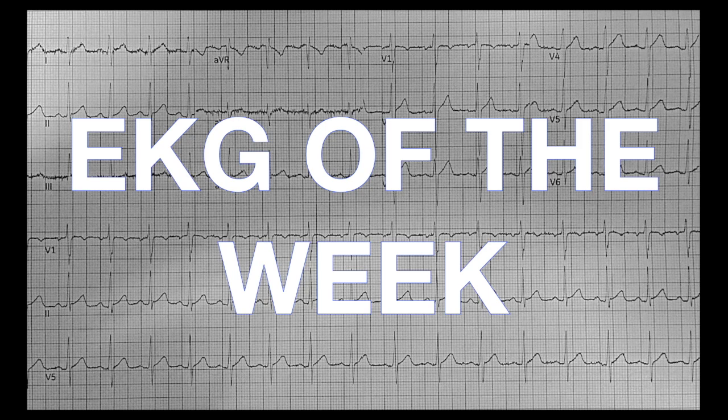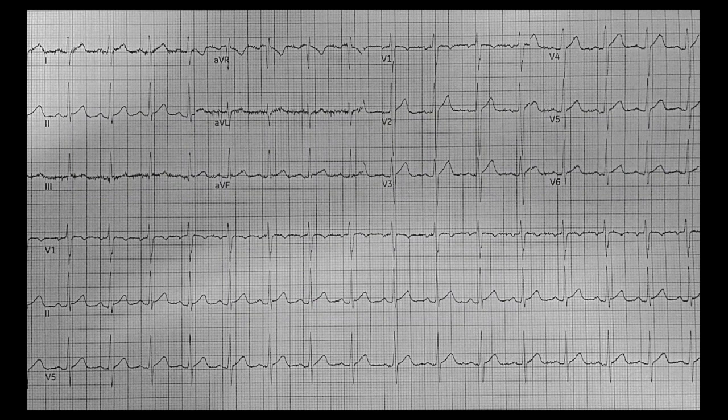So let's talk about this here skill. We'll start off each time looking at an EKG, and feel free to pause at the moment and see if you can interpret this one. We are going to go through it, though, in a systematic manner so that we don't miss things, because everybody can just look at an EKG and say, okay, well, blah. But are you really hitting all the parts?